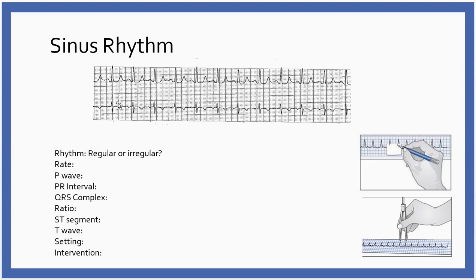And so remember, that has to start at the beginning of the P wave to the beginning of the QRS. Now, it's going to drive your eyes bonkers if you try to sit and count baby boxes. It's really, really hard to do. So one of the things you can do is take that scrap of paper that you had and lay it right underneath here, okay? And then draw a line on the paper. Here's the beginning of my P wave. Here's the beginning of my QRS.